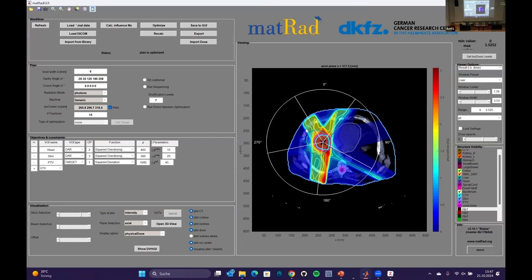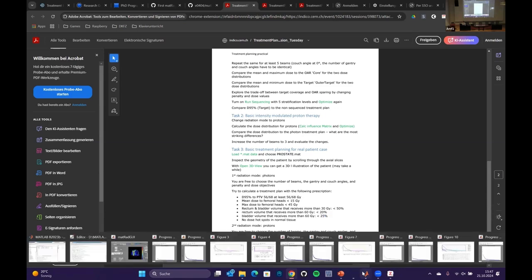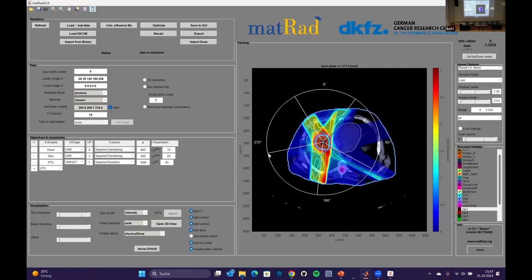All right. So I will not try to make this photon plan good. You can have this experience of tweaking a plan on your own a bit, just try to make the plan without hotspots. If you go to the workflow one that I showed you earlier, there's a very difficult example that is challenging to achieve. You can try this on the prostate patient if you're interested to play around a little bit. I just warn you, it can be frustrating. There is some experience and good education needed to do this really smoothly.